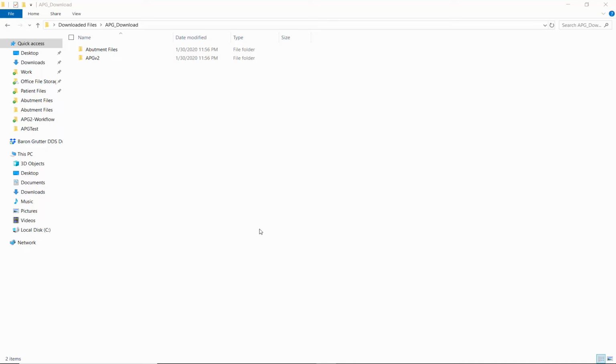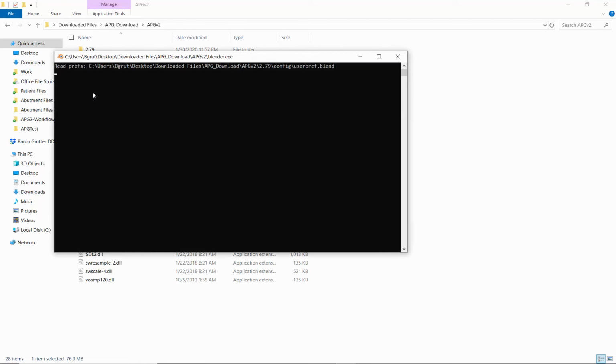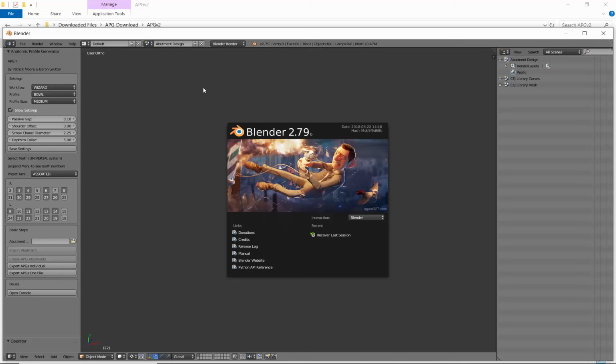Okay, so in this video, I'm going to show you the actual software and how we're going to work forward with it. So if we open up this folder, click on this file that says blender.exe. The APG software is built on Blender. So we're going to be working inside that environment. You do not have to know how to use Blender.